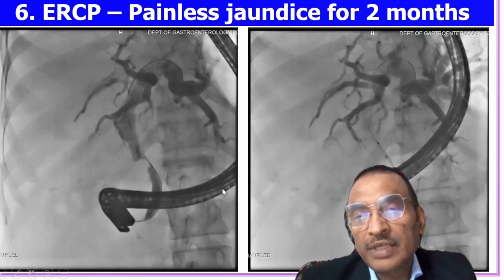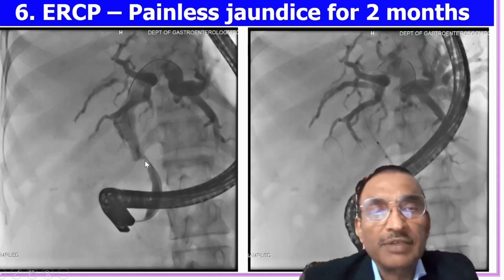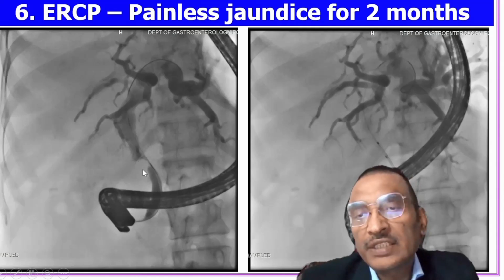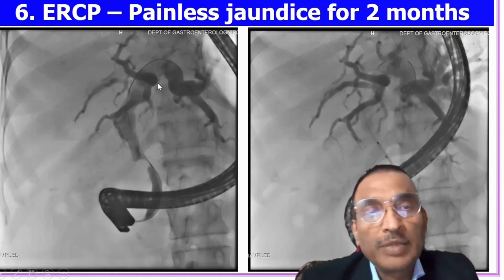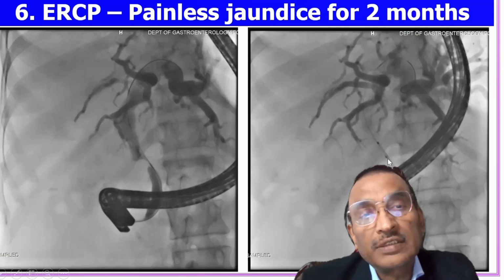So pancreatic duct we have not specified, and bile duct, what is it showing? It is showing a stricture in the middle of the CBD. The cystic duct is not specified here, and then we have right branch and left branch which are all dilated but not much irregularity. And then what we are seeing here, you are seeing two dots. So which is this accessory? So this is a combo cath or biliary brush.